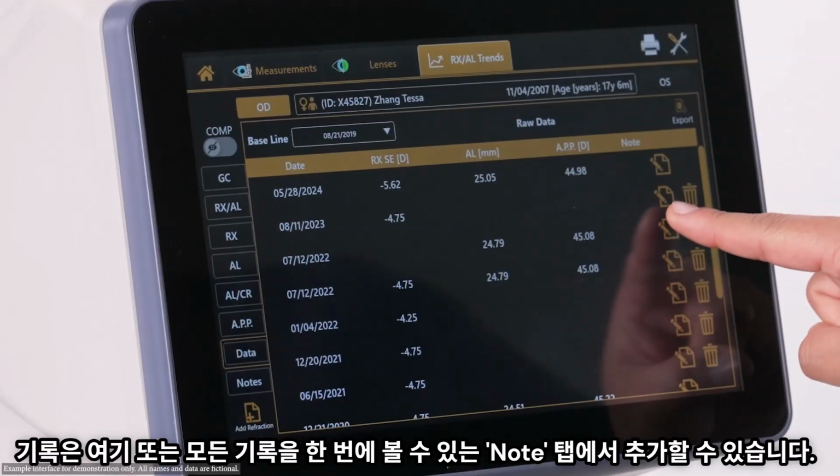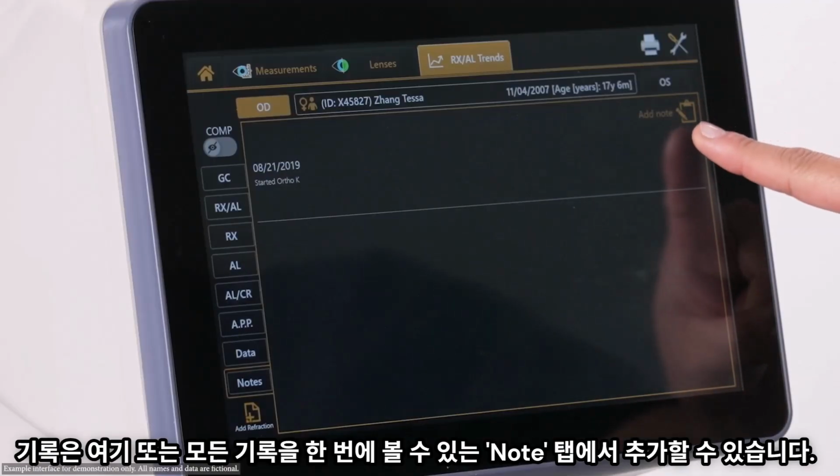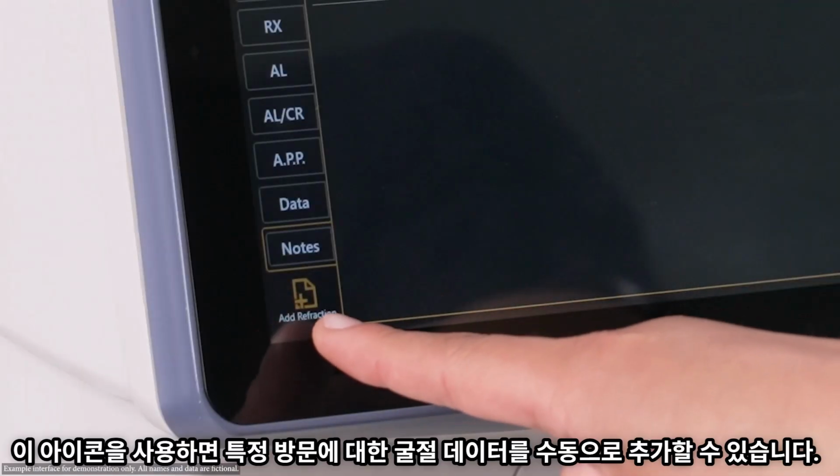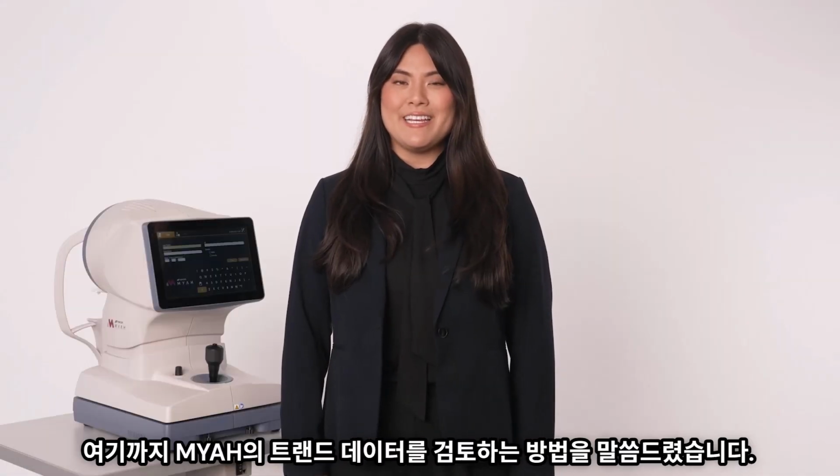Notes can also be added from here or from the Notes tab, where all notes can be viewed at once. This icon allows you to manually add refraction data for a particular visit. And that's how to review trend data using the Myah.